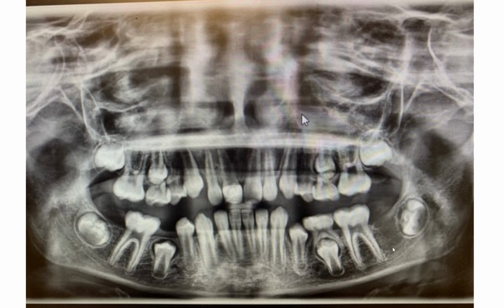Having said that, it does still appear to be relatively close to the mandibular canal, but once again, it's small. I would think it's a lot more manageable, but they left this to grow 2 more years. So I don't know the full clinical picture of what has happened since this panoramic radiograph.